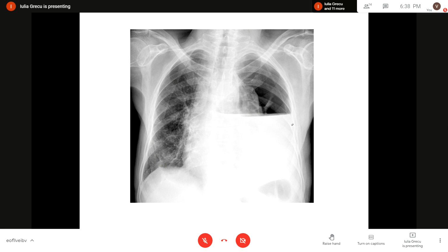Okay, very, very good. Could you say something more in terms of complications that you can foresee here? Death? Okay, no, we try to fix these patients. It doesn't look good, I know. What extra signs of concern can you see on this image?